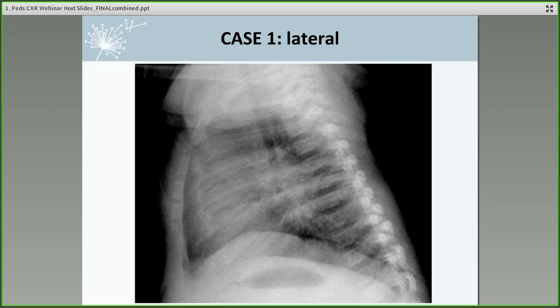She has no cough. She's growing. She has no fever. Absolutely not. The finding is real because you have confirmation on the lateral chest radiograph. You have to figure out what that adenopathy is, and given that she's a baby from Ethiopia, they're definitely concerned for TB, and you have to chase that. You can now be certified as a pediatrician.